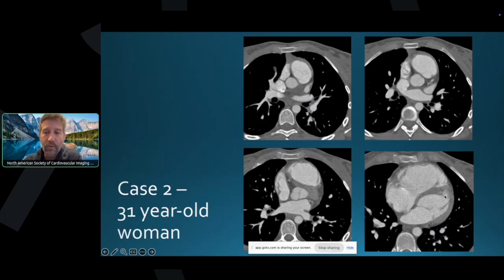You can see parts of the interventricular septum looks intact here. Atrial septum looks intact as well. Same here. There's a slightly higher cut here. We see the pulmonary veins coming in, left inferior and right inferior pulmonary veins. The higher portion of the atrial septum is intact, and the right ventricle is dilated. When we go a little bit higher than that, we find this abnormal communication, very high in the atrial septum.